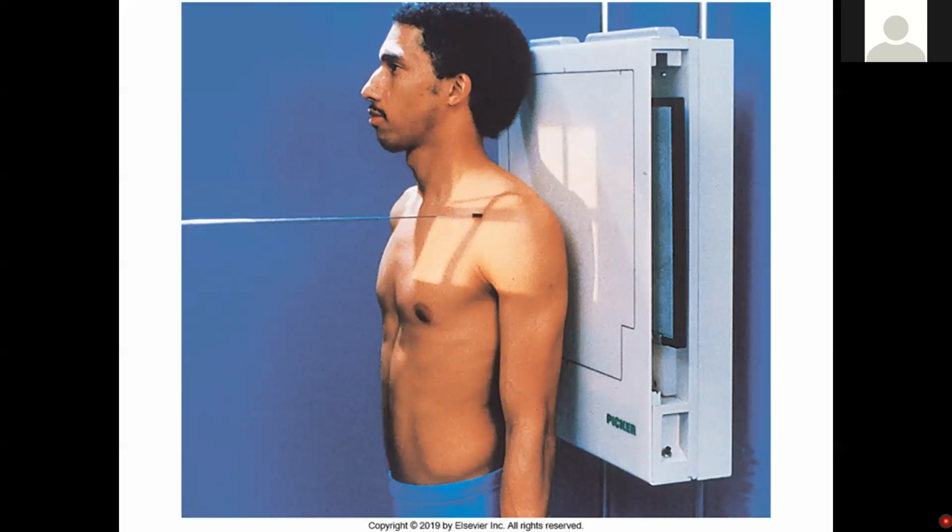This illustration of a clavicle from Merrill's has some issues, as we've seen on the shoulder illustrations. On the model, you can see where the clavicle lies. So the central ray is pretty much along that. I don't have issues with the centering per se. It's all about collimation here. This collimation goes up all of his neck, a good chunk of the torso, and I'm not sure that it extends all the way to the jugular notch so that you would have the medial clavicle represented. So by all means, collimate significantly around the area of interest here.